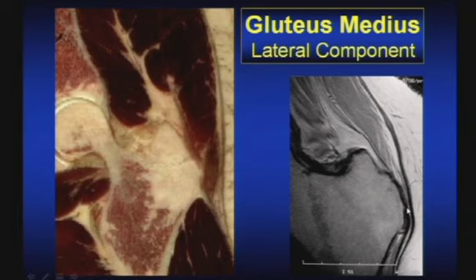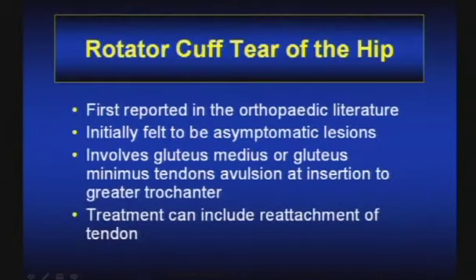So the gluteus minimus is attaching to that anterior facet, wrapping around the trochanter. At the lateral facet, we have gluteus medius muscular attachment. Then posterior and superiorly, we have the gluteus medius tendon to that posterior superior excrescence on the greater trochanter. That posterior facet, or the posterior margin of the trochanter, is bare. There is no soft tissue attachment site in that location. The trochanteric bursa covers the posterior facet. Okay? We know the gluteus maximus extends down the posterior aspect of the linea aspera, so we're not looking for a soft tissue attachment site in that location.